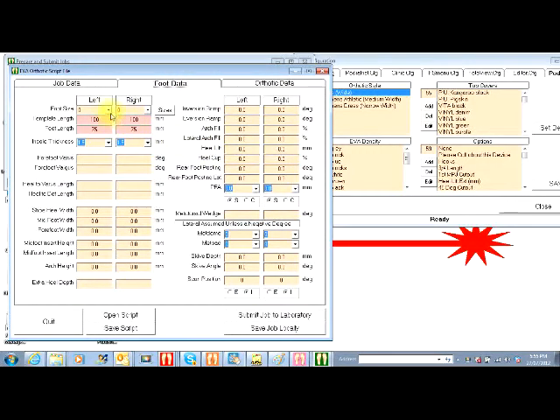Now the foot data, the template sizes, you do need to put roughly what size. This is the size of the shoe that they use. The insole thickness can be varied, whether they're measuring from where the bisection is, what the varus or valgus angle is. If it was 4 on the right foot, you put that in, the foot had a varus. Then these measurements that I've spoken about before, between the dots on the feet, if it's 121, you would put that in. You might have measured that side to 123, and then the heel dot length was the back of the heel to where that dot would sit in the shoe.